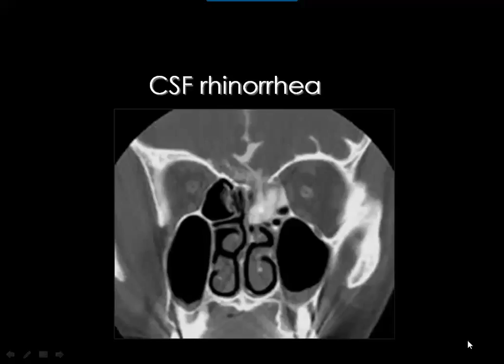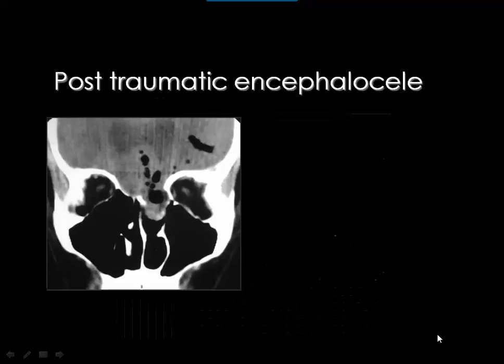And this is a very big defect, which does not need actually to examine the patient with myelography, and they see the contrast material is leaking into the ethmoidal air cells.